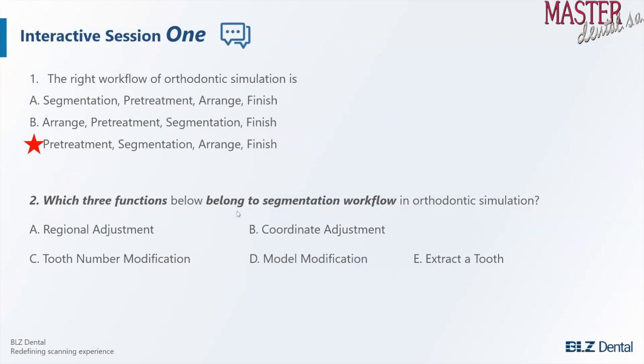Which 3 belong to segmentation workflow? Segmentation workflow is the most important step among all the workflow of orthodontic simulation.